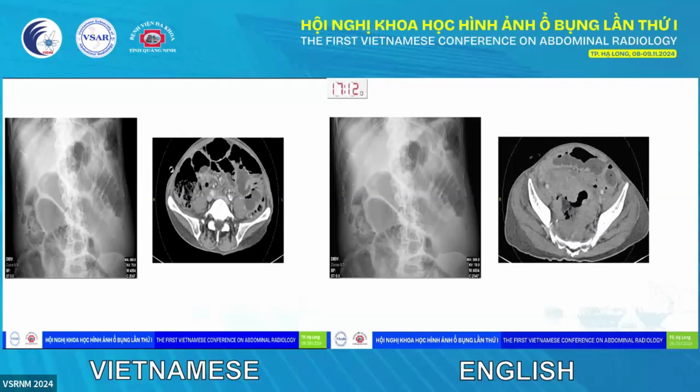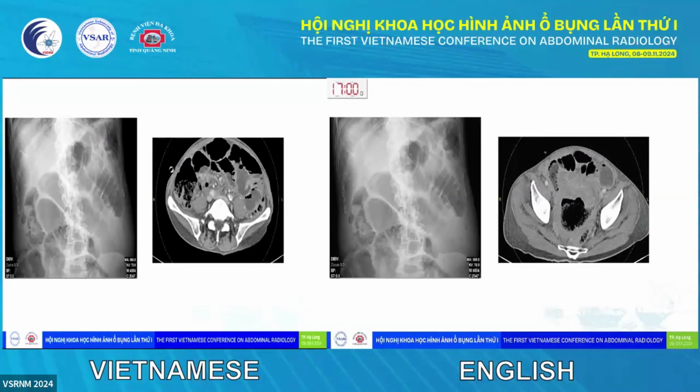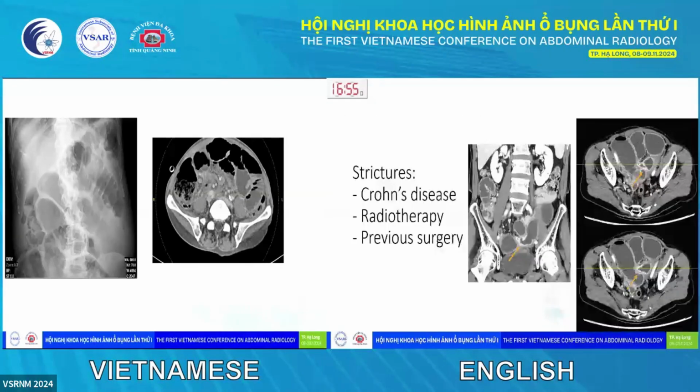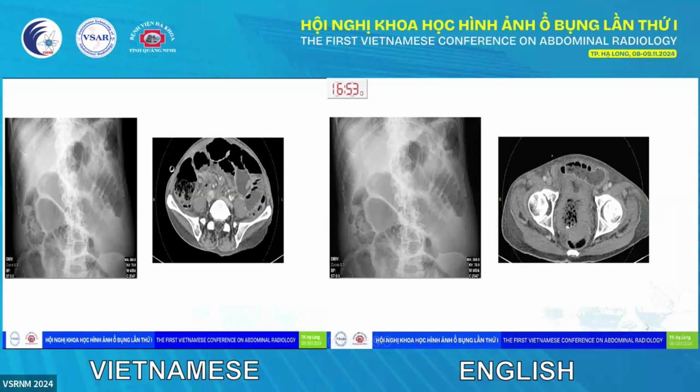This was an interesting case. We postulated that this could be due to either a necrotic GIST or a lymphoma, given the long segment appearance and the possible aneurysmal dilatation. However, this patient declined further investigation, as she was not keen on any further investigation. As such, we were unable to obtain the formal diagnosis.